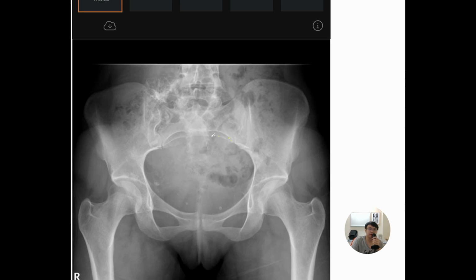If you are new to this, I will screen the main pelvic ring here, which is formed by the promontory of the sacrum, the bilateral sacral ala, the anteroinferior aspect of the sacroiliac joints, and the iliopectineal line, forming the complete ring. Eventually it ends at the midline as the pubic symphysis.